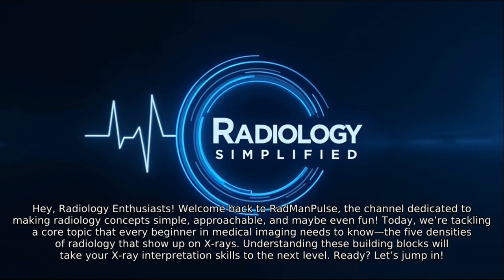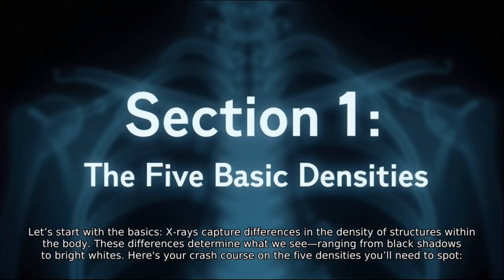Today, we're tackling a core topic that every beginner in medical imaging needs to know: the 5 densities of radiology that show up on X-rays. Understanding these building blocks will take your X-ray interpretation skills to the next level. Ready? Let's jump in. Let's start with the basics.